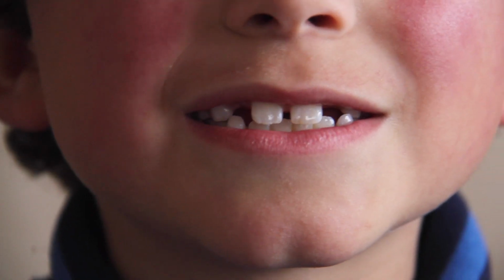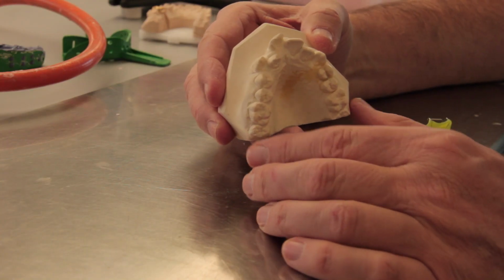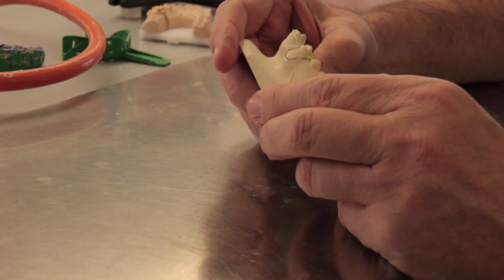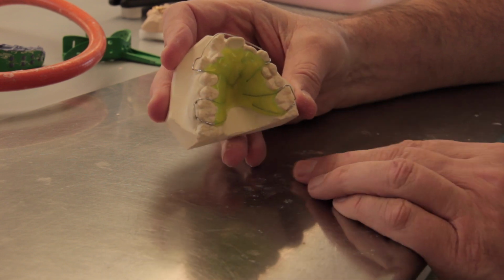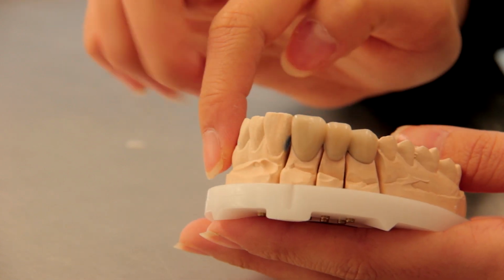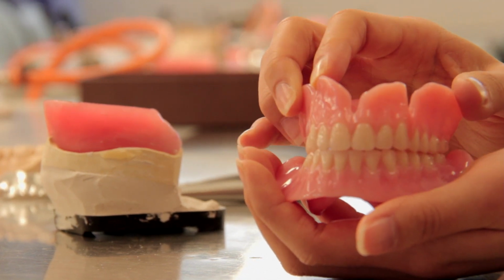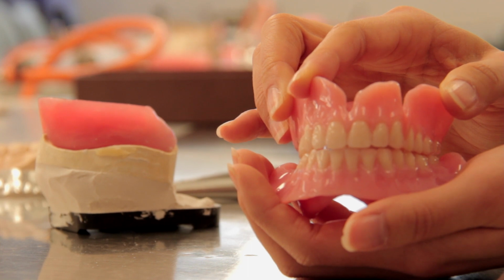And dentists have to make one to fix problems that may affect your teeth in the future. For example, when teeth grow in different places, the dentist has to make appliances to move them to the right position. To make new teeth to replace damaged ones, and to create a whole denture, these are the most common problems for which the dentist has to make a model of your teeth.